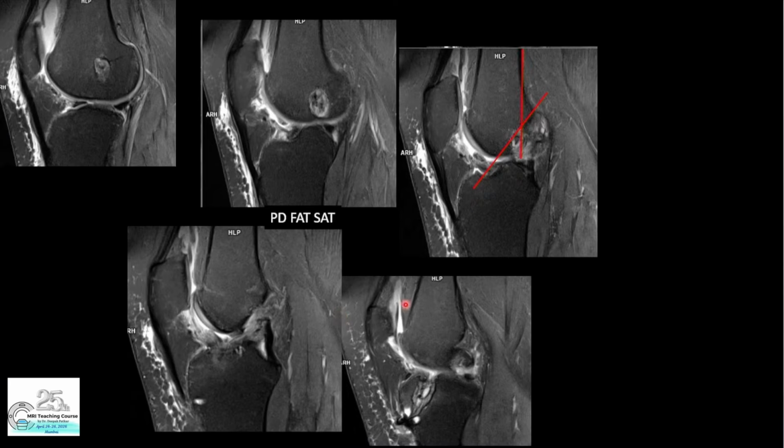So when you assess the location of the femoral tunnel, normally the femoral tunnel should be posterior to the posterior cortical line. Here it is lying anterior and inferior. So there is a low position of the femoral tunnel. As far as the tibial tunnel is concerned, it is no longer posterior to the Blumensaat's line. So it is anterior, and the graft is horizontal. It is poorly seen. It is more than 2 years post-op. So obviously we are dealing with a graft impingement with partial thickness tear.